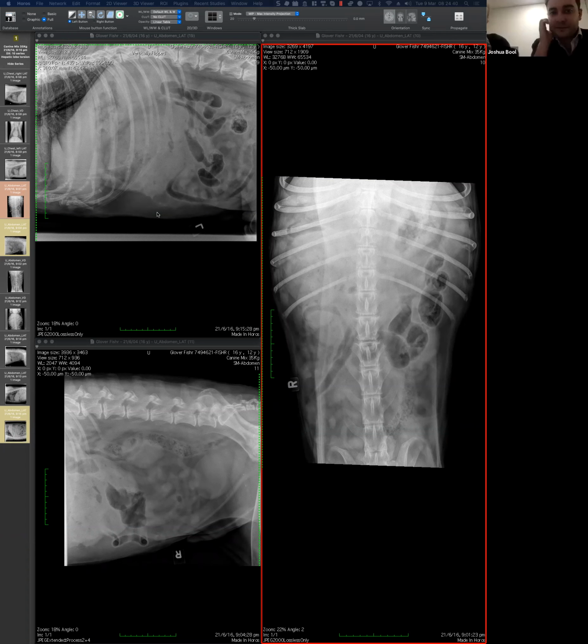I don't know if it's worth noting here, but the gastric axis seems to be a bit more kind of vertical here. So I'm just wondering if that means that potentially the liver is smaller, or if potentially the stomach is just empty and that's a factor. I'm not sure if we kind of touched on stomach.